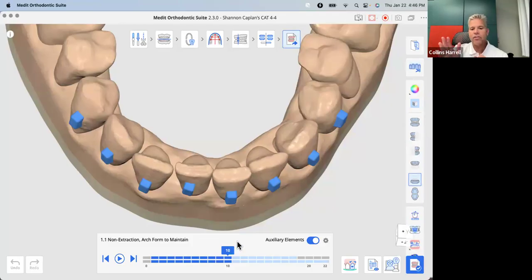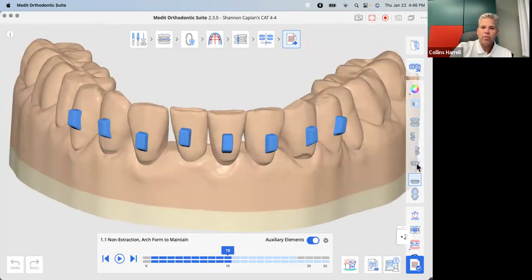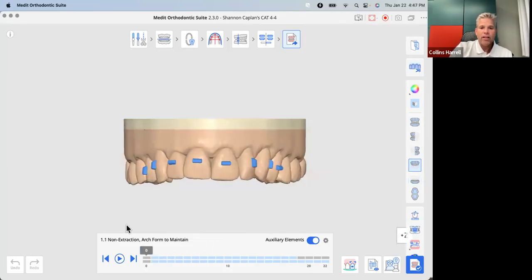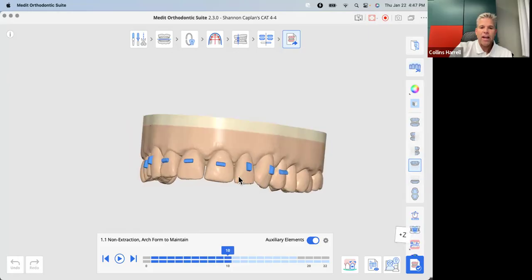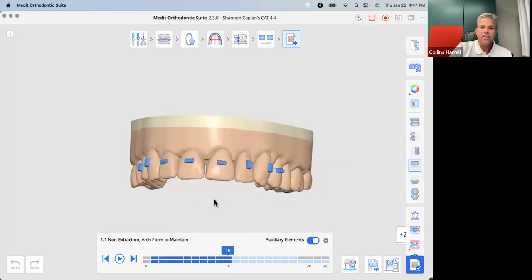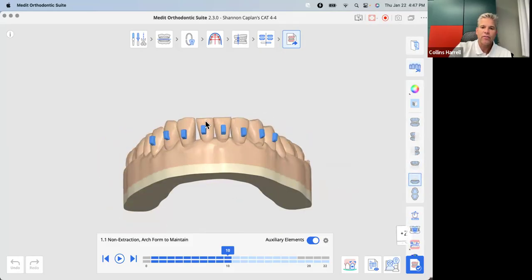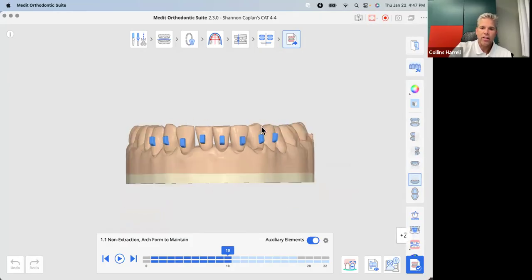So it's like my first set of aligners, I just want to make sure everything is moving in the right direction. Everything's opening up, kind of what I would expect to happen when I put nickel titanium wire into an arch form. And I just want everything to start to unravel. And then a lot of times initially we forget to do, like this isn't a good example, but a case where say that the incisor edges are all irregularly worn. Once we've gotten to this point, it's a lot easier now to go in and start refining the anatomy of the incisal edges, the cusp tips, and really start to make the case look nice so that as you start to dial in those final details, you have straight incisal edges.